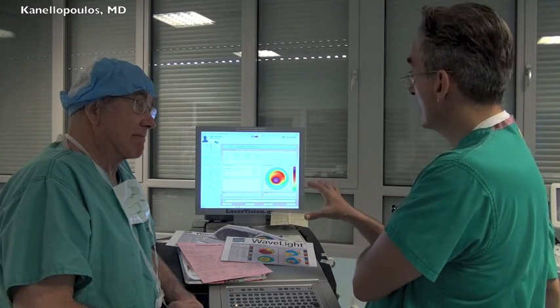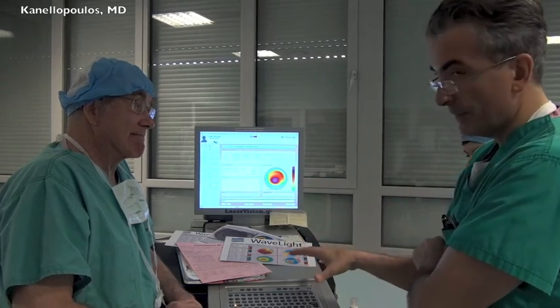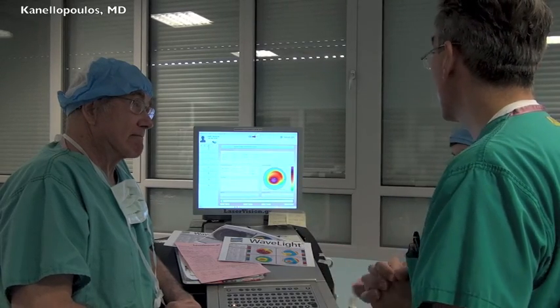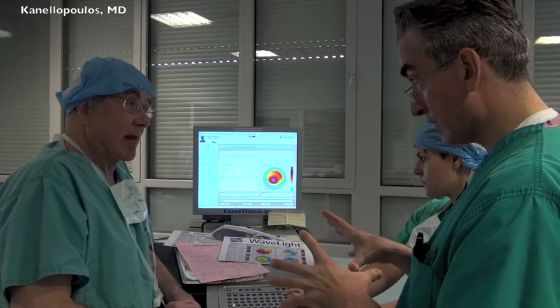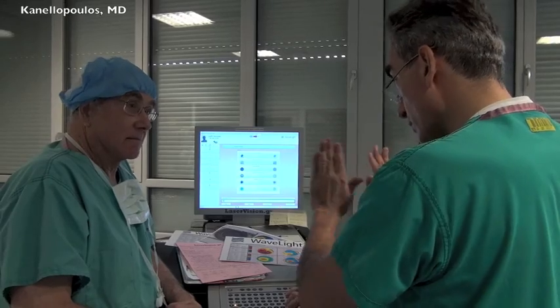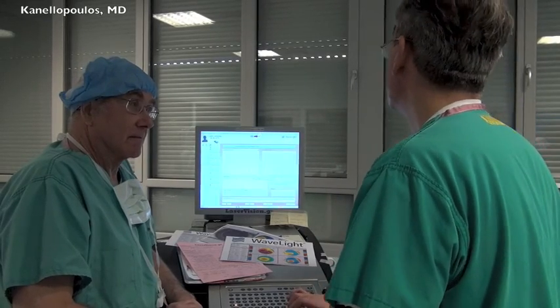So this is the, we'll save these. These are the Pentacam-driven topo-guided. So let's save these also. And then we'll do the same exact exercise with placido disc images. And then we'll compare the two. We'll try and see how the two compare.